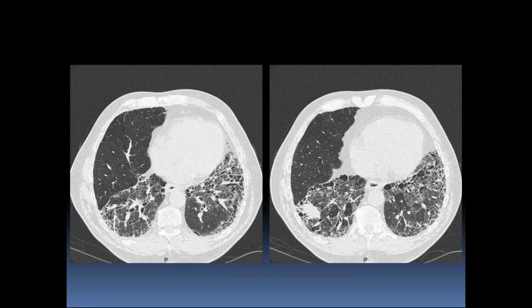This next case is a little bit different, and I actually showed this in Dr. Rocky Sign's board review a number of years ago, just as a challenge case. I have easy cases and medium cases and then challenge cases, and this one was a little bit difficult because of the ramifications of what happens with fibrosis. So you have typical findings of the traction bronchiectasis. You have some mild honeycombing here, and you have the similar findings as well within volume loss of the right lower lobe. You can see the retraction of the major fissure, so that's indicating some volume loss because of the fibrosis.